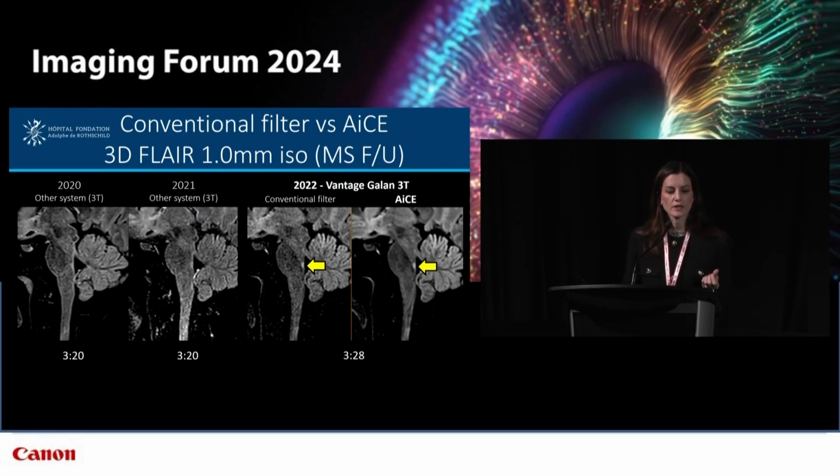So we can see that the lesion in the posterior pons in the region of the medial longitudinal fasciculus is much more clearly visible after ACE, and finally explained an internuclear ophthalmoplegia that had gone unexplained radiologically up until then. Obviously, in retrospect, it was there, just too noisy for it to ever have been called confidently. And there's also an additional lesion in the upper spinal cord, which had up until then been missed.